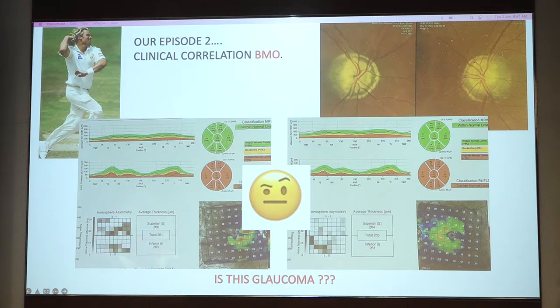So here basically the nerve has completely atrophied. What you are measuring here actually is the drusen. The nerve fiber layer is gone and the ganglion cell is gone. So this is actually an open and shut case of glaucoma, and this is basically seen by you because you are actually measuring the drusen, and this is never going to reduce. This will be the same throughout his life. So this is very, very important.